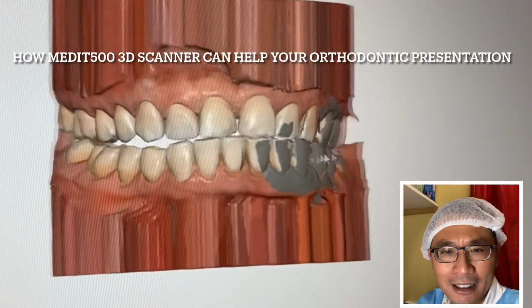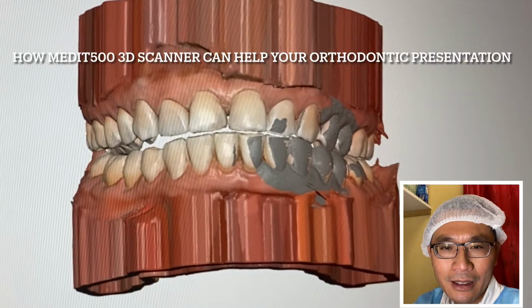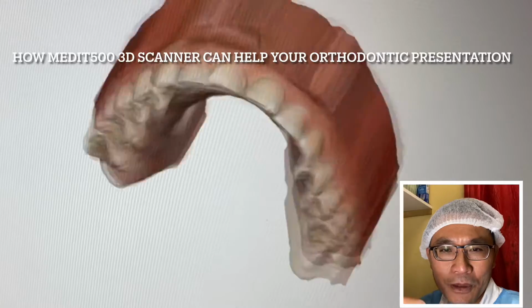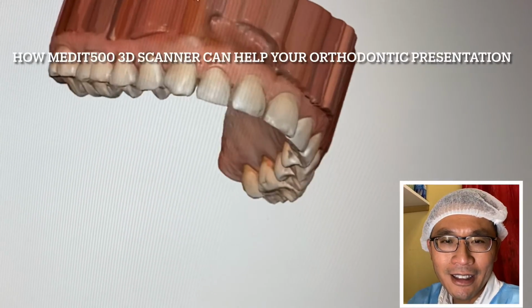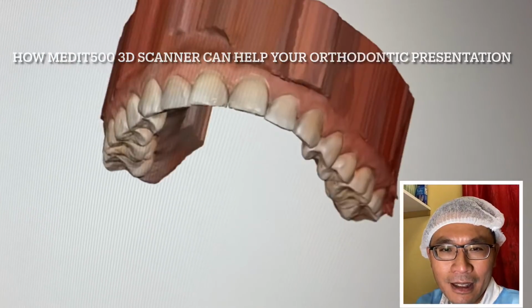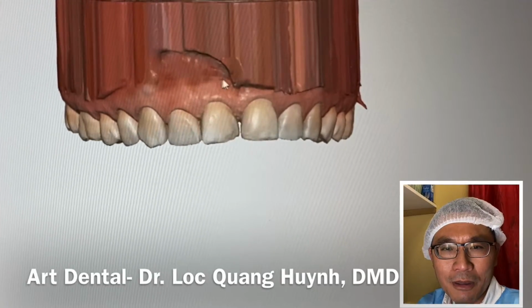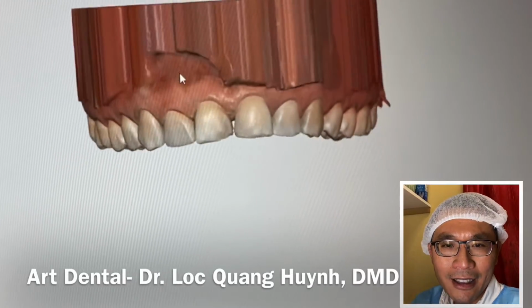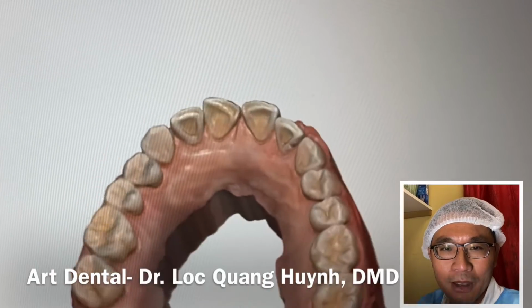In this video, I will show you the scan of the upper and the lower and how the occlusion comes about. So take a look at the upper arch right now. I scanned the upper arch for the patient, who came to my office several times for cleaning and so on. Now we have an opportunity to get to know the patient more, and so we can talk to her about the option of correcting these front teeth right here, number 7, 8, 9, 10.